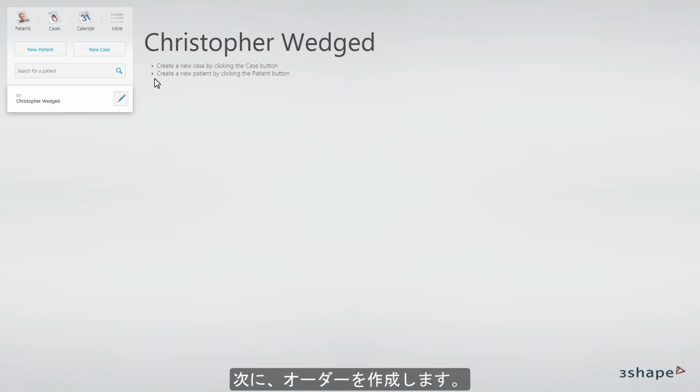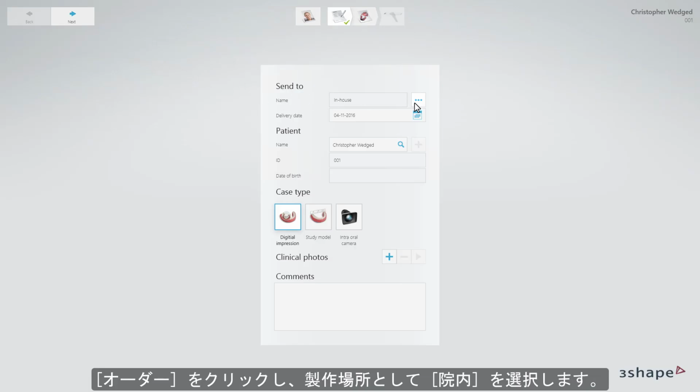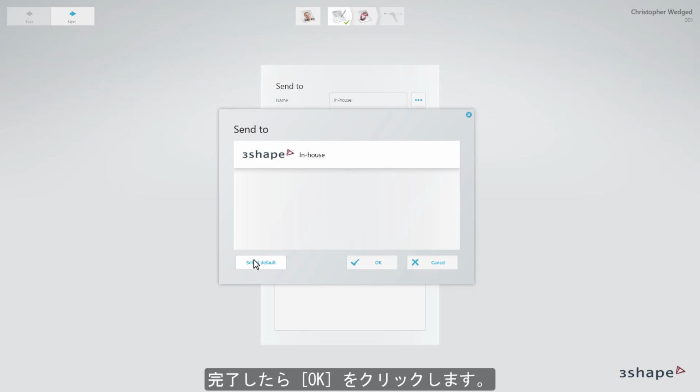Then create the case. Click on Case. Choose In-house as the place of production. You can set it as default in situations when you have many labs on your list. When done, click OK.